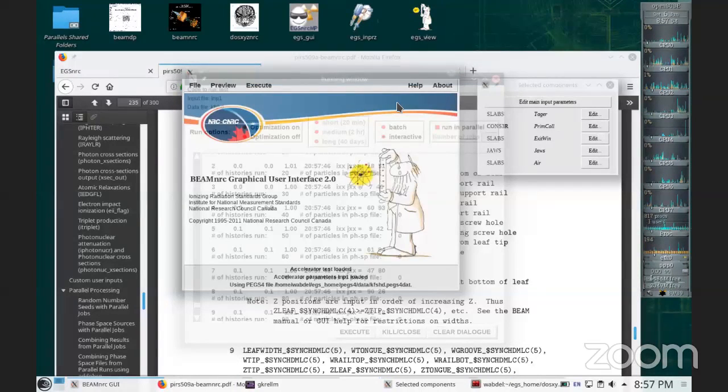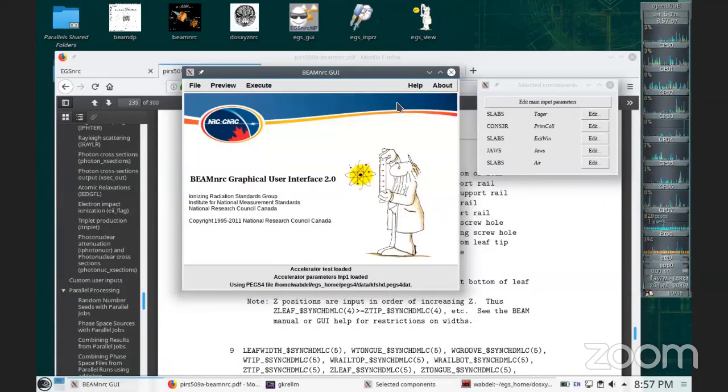So we have a linear accelerator model. Now, the important question is what sort of output we want from this simulation. For DOSRZ, probably the output that we want is the dose at different regions. For DOSXYZ, also the dose in different regions. But in beam simulation, you have to think what sort of output you want. One important output is called the phase space file.